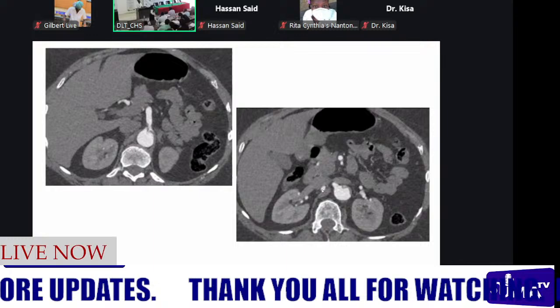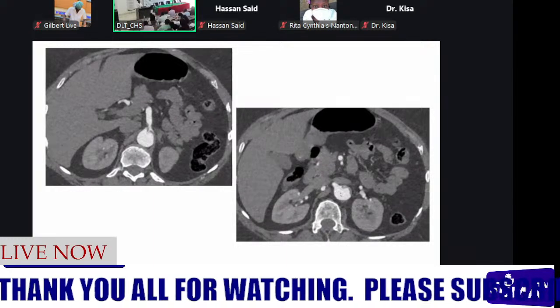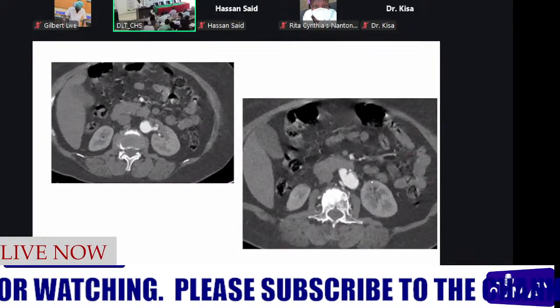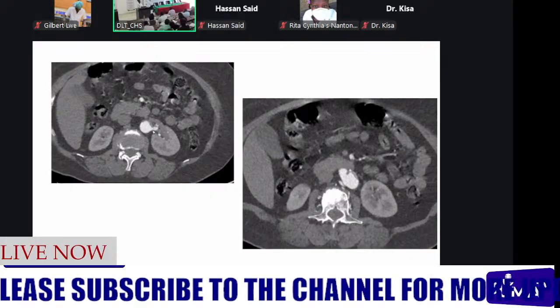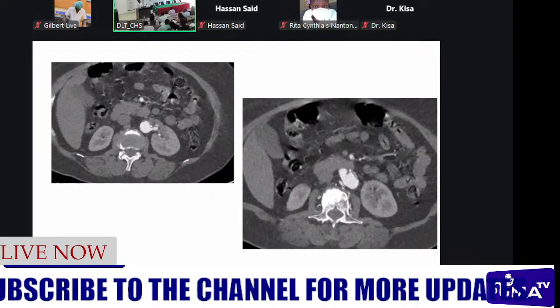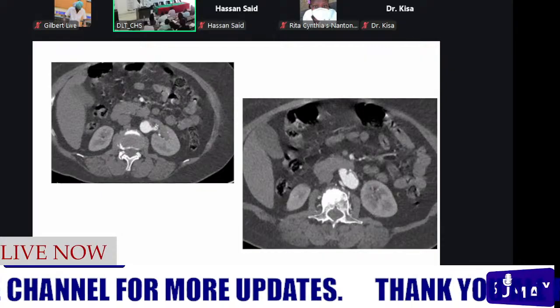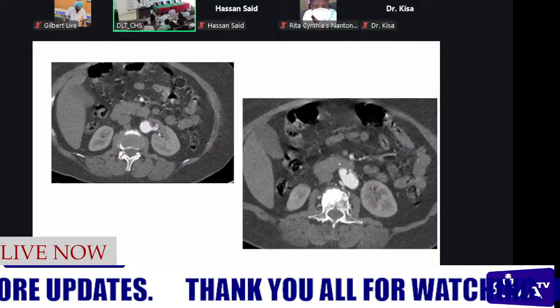So the right kidney is receiving its supply from the true lumen, so it's well perfused. Then for the left kidney here, we can appreciate that the dissection is extending as well to the left renal artery. However, most of its blood supply is from the true lumen.